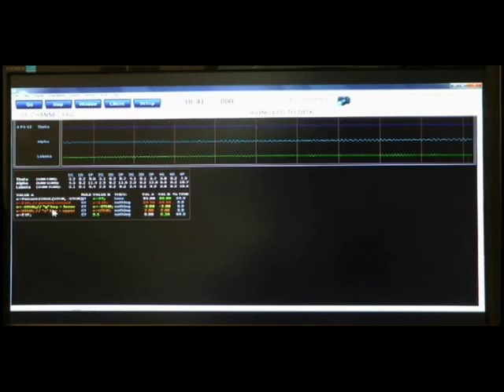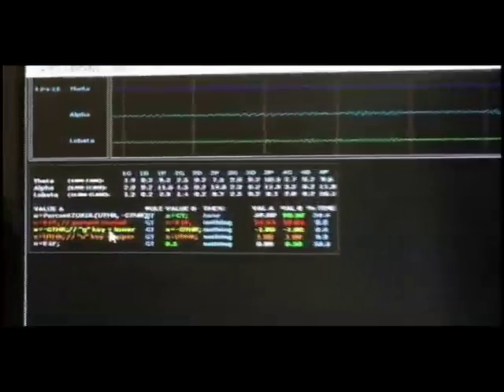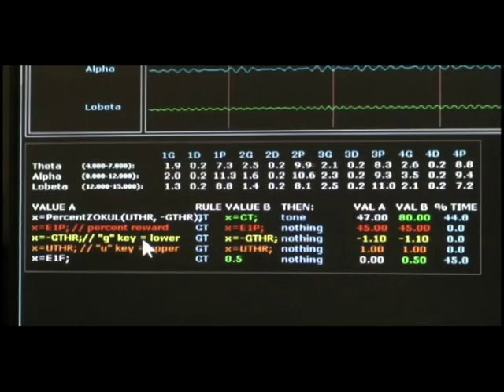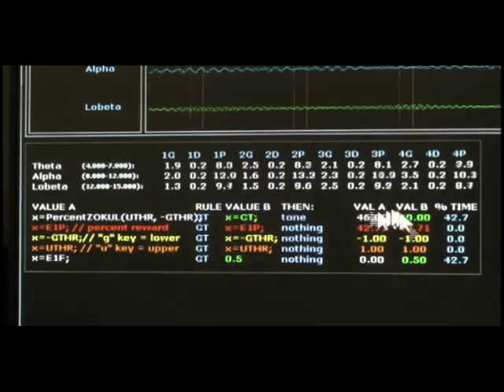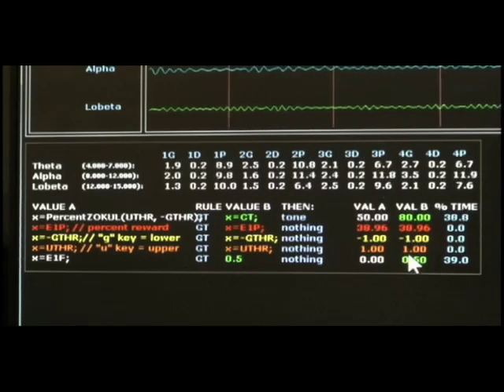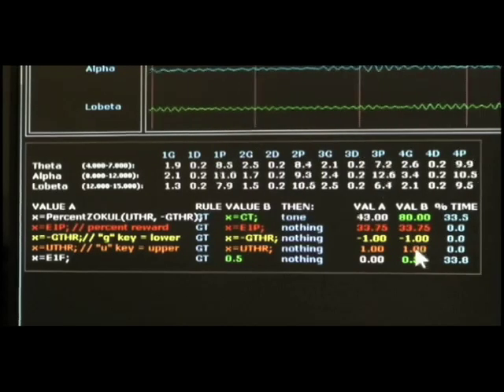So as you watch this screen, as I hit Shift U, notice how I can bring that down. Okay, and let's say I take it to 1 standard deviation, and above it the G, which is the negative, let's say I go Shift G, and you see I bring that to -1.0. Okay, so now instead of having 2 standard deviation to -2 standard deviation, it's 1 to -1. Okay, so very simple to make that adjustment.